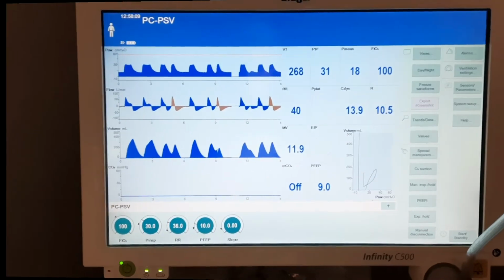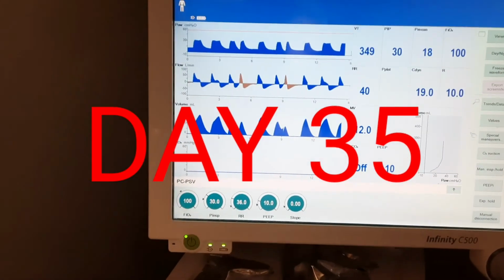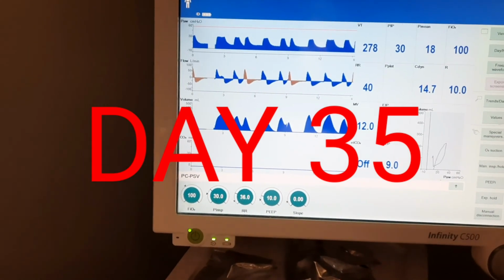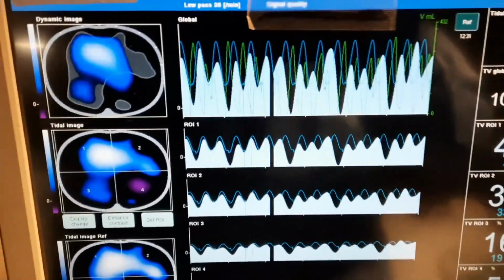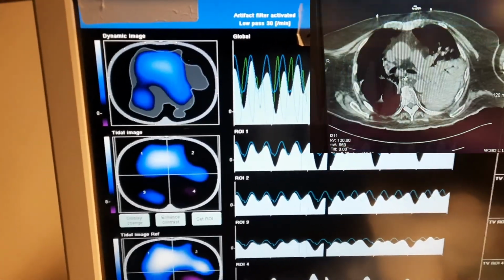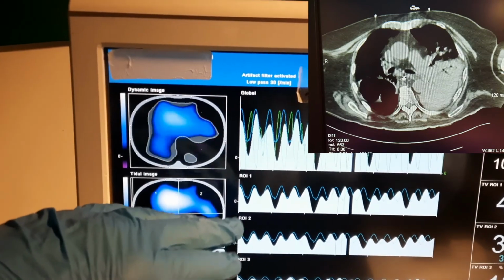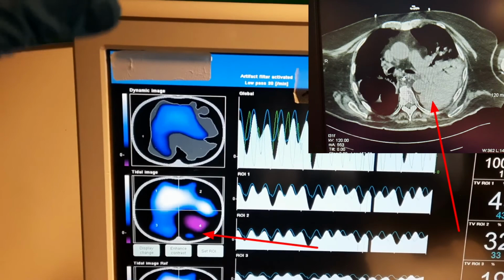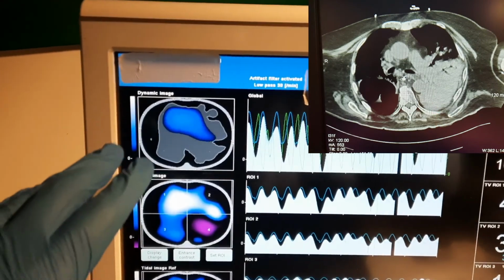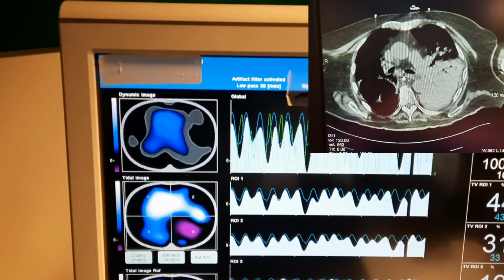Very poor prognosis. So obviously, we have a very high driving pressure of 20. That's well above the 15. We're whiteout on the CT scan. On the CT scan, you've got definitely the left dorsal, mid dorsal, possibly mid ventral. You start having aeration, but the left side is quite atelectatic.